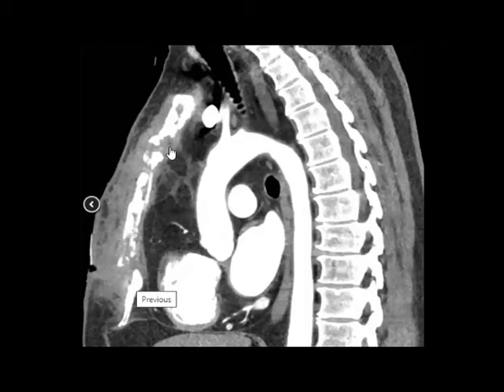So all this, if you don't describe in your report, if you are in the exam, you will lose some marks. So try to be used to making the description and to describe well. Then it is time to interpret. The interpretation will be either metastatic or lymphoma, nice, leukemia, nice, and osteomyelitis.